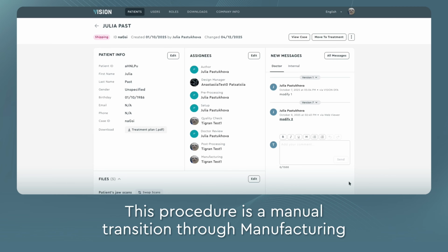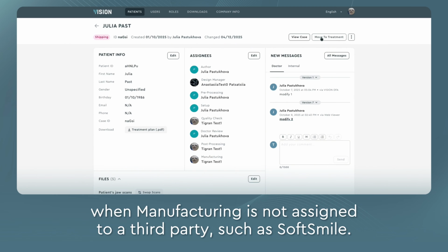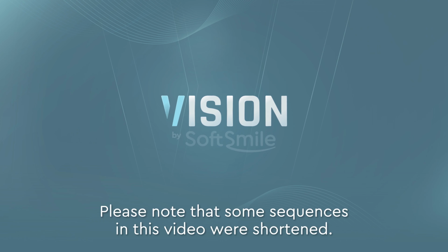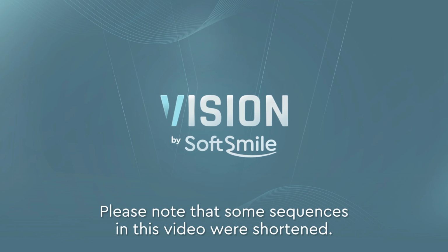This procedure is a manual transition through manufacturing when manufacturing is not assigned to a third party, such as SoftSmile. And this is how manufacturing works. Please note that some sequences in this video were shortened.